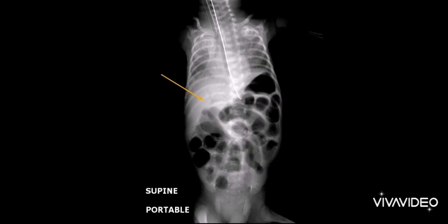Okay, so it can also be seen in this slide. And again, the liver's not shown as completely white. There is the branching of the trees off there. You may hear a little bit of rain going on. It's a bit of a noise which is distracting us slightly, but we'll continue.